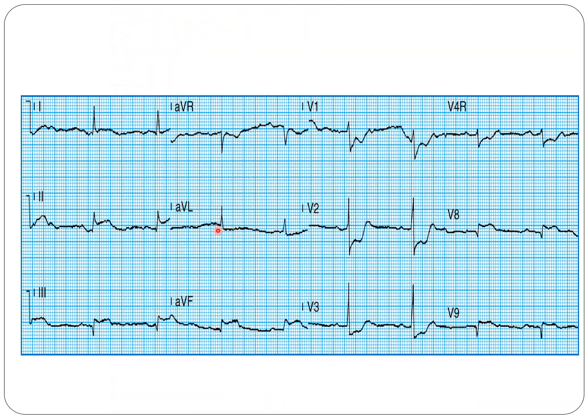Now looking at the P wave, it should be seen in lead 2 or in V1, and I can see it only, for example, here in V3, and it looks like a sinus rhythm because it's rhythmic. So that's a sinus bradycardia.